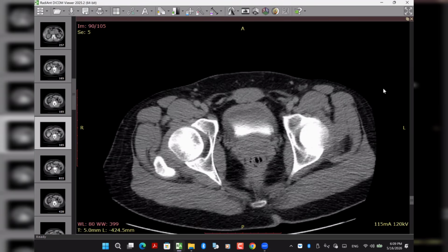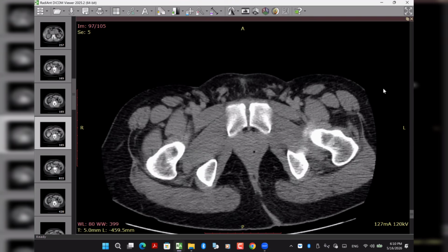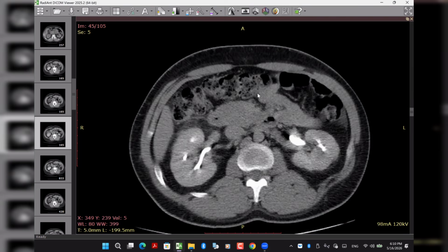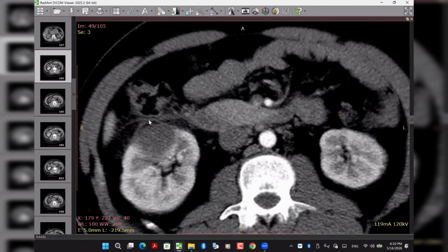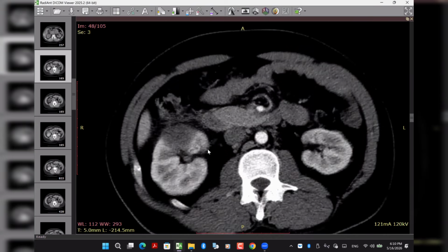Okay. So even the urinary bladder does not show any abnormal filling defects. I would ask for the patient's history, as I'm suspecting that this is a case of pyelonephritis, with maybe an evolving... What is this? As Dr. Muhammad put an excellent case in the first part of this session. What is this? Yes, he said it could be like the evolving stage of an abscess, so lobar nephronia.